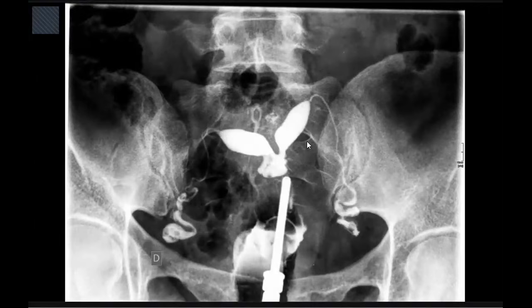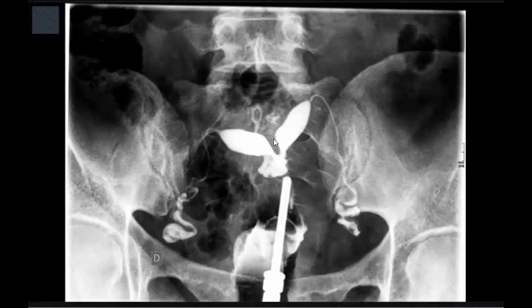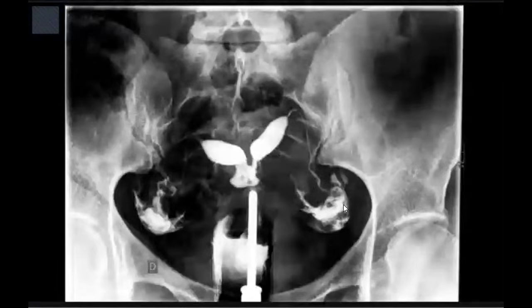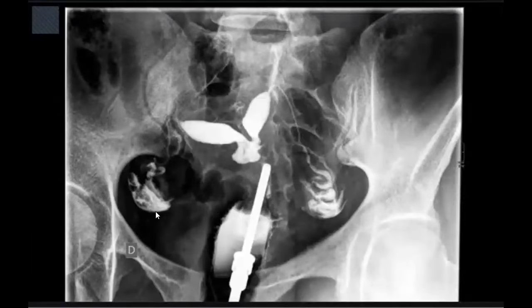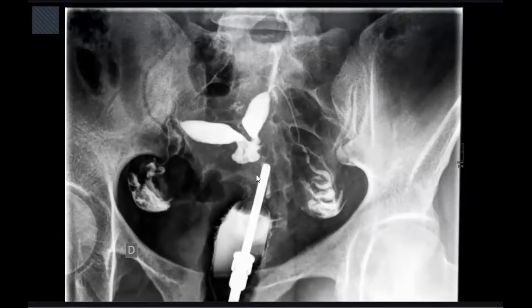Okay, hysterosalpingiography. We have to comment on the uterine cavities. We can make a broad term: two uterine cavities separated from each other, widely separated. I can see the contrast through both fallopian tubes. I will scroll through the image. There is some spillage here and some spillage here, and here also. No so much dilatation of the distal fimbrial end of both fallopian tubes. And here there is a spillage. This is about the tubes.